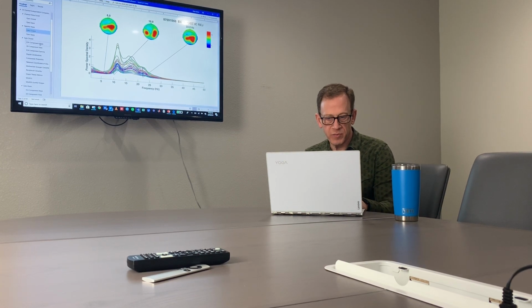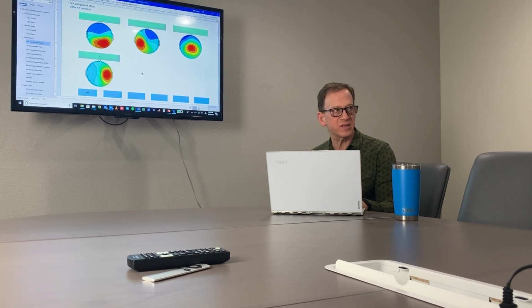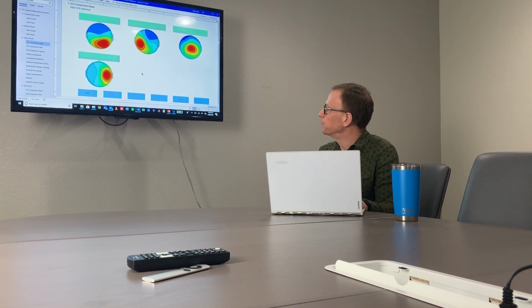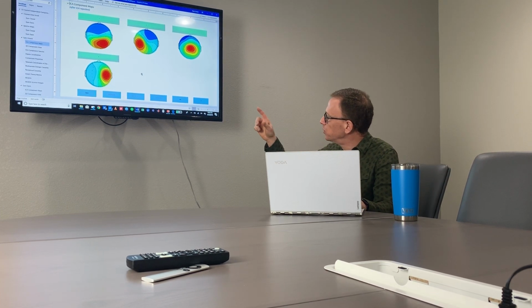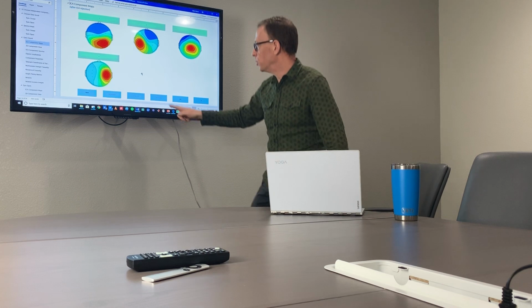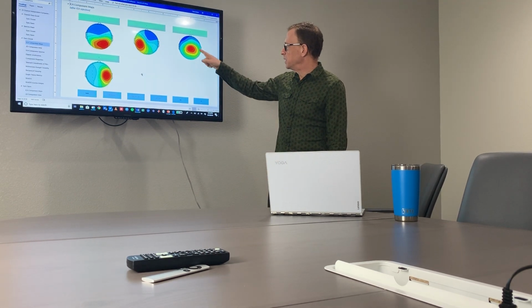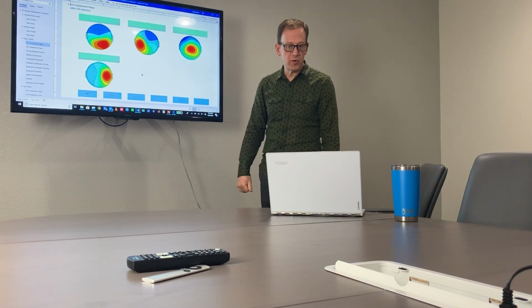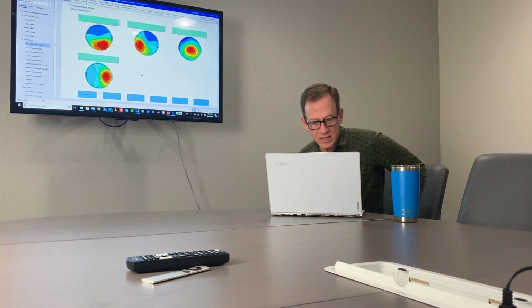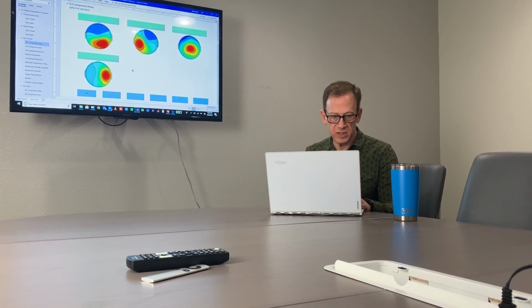As we go down to the components, we can now see that they further isolate those regions of the brain. So we have 2 on the right side, 1 over the central and 1 over the parietal lobes, a central location and a left central and parietal location. And each of these represent different type of activity in the EEG.